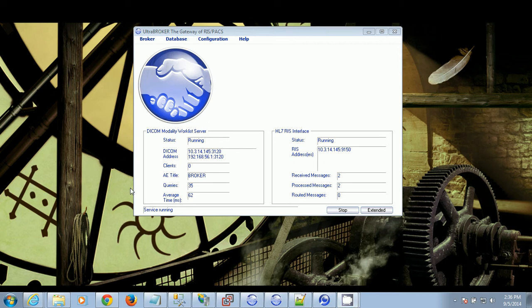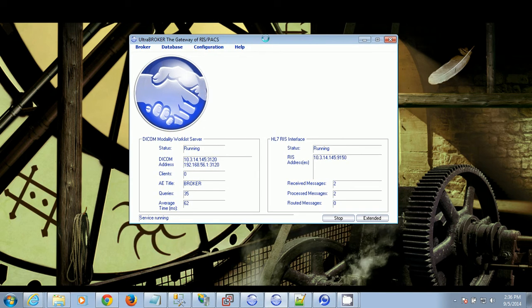In this demonstration video, I'm going to discuss some things about UltraBROKER. Specifically, we're going to look at the use case of having a hospital information system or an EMR that can send ADT but does not support orders or any kind of order messaging. Just some of the options that we have.